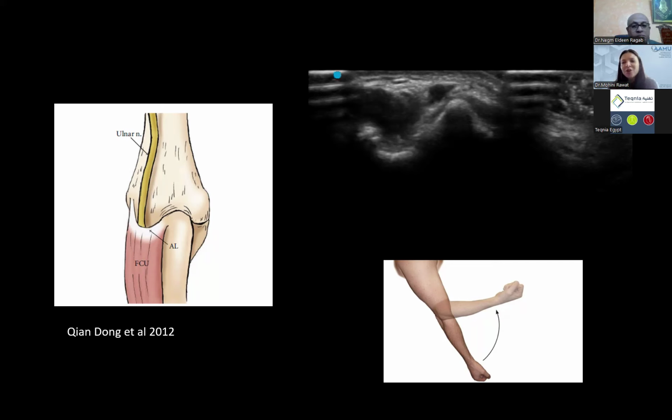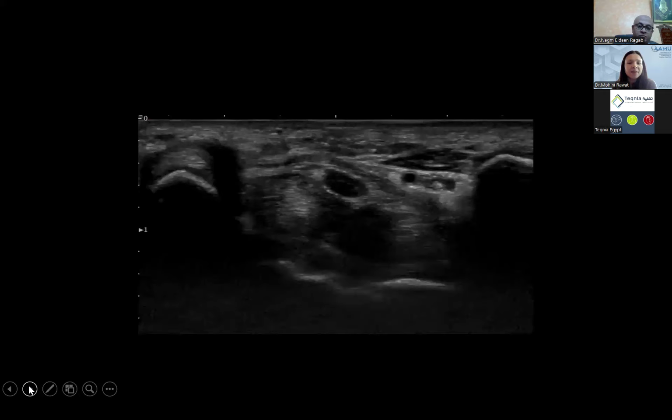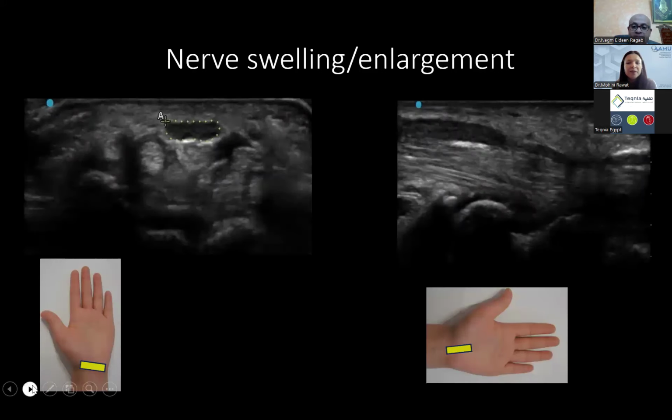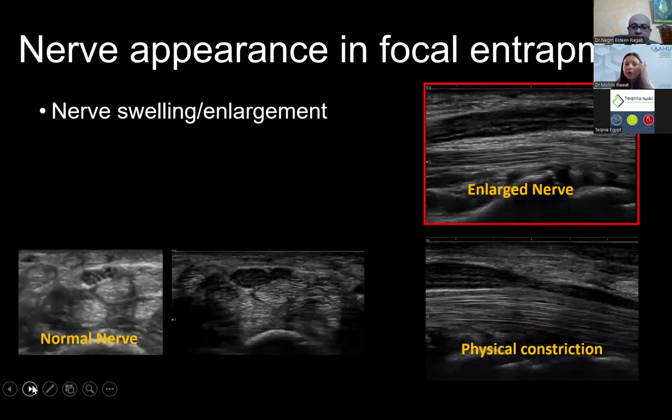Yeah, so I did not include the information on power Doppler because most of the people who are using ultrasound know it. Power Doppler is a great tool, and you can see increased blood flow. That speaks to the same thing when we say that there is intraneural increased blood flow, which is what's happening here when there's enlargement. So yes, you do see increased flow on power Doppler.